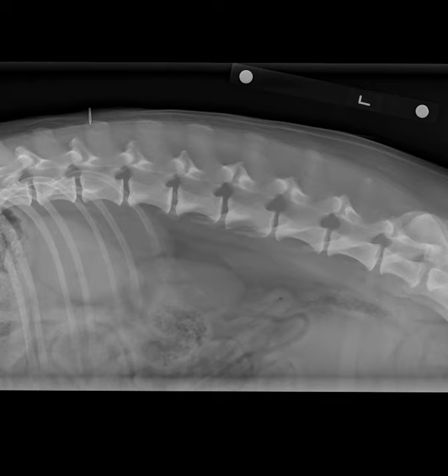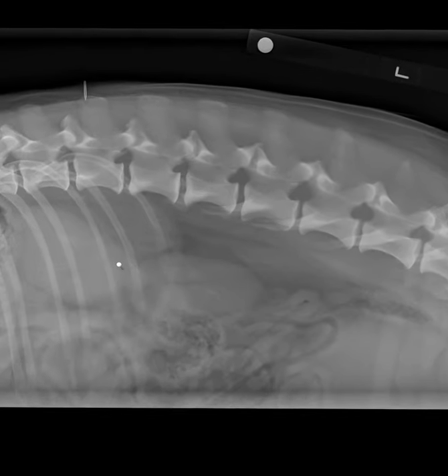Additional assessment in patients with T3-L3 myelopathy usually requires cross-sectional imaging, such as MRI or CT. Now that you've had a chance to look at the spine, you've heard me say that I follow the ABCDs approach: alignment, bone, cartilage, devices, and soft tissues. For spine, the alignment piece requires careful review. I want to show you what I do.